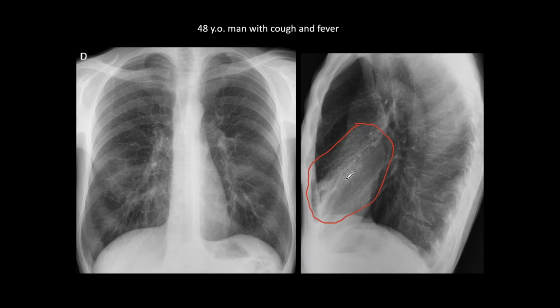Those are the areas that are superimposed over the lung on the lateral view. And this is the most common abnormality that you are going to see in the lateral view over the cardiac shadow: superimposed pulmonary disease, either nodules, bronchiectasis, or acute disease in the lingula or the right middle lobe.